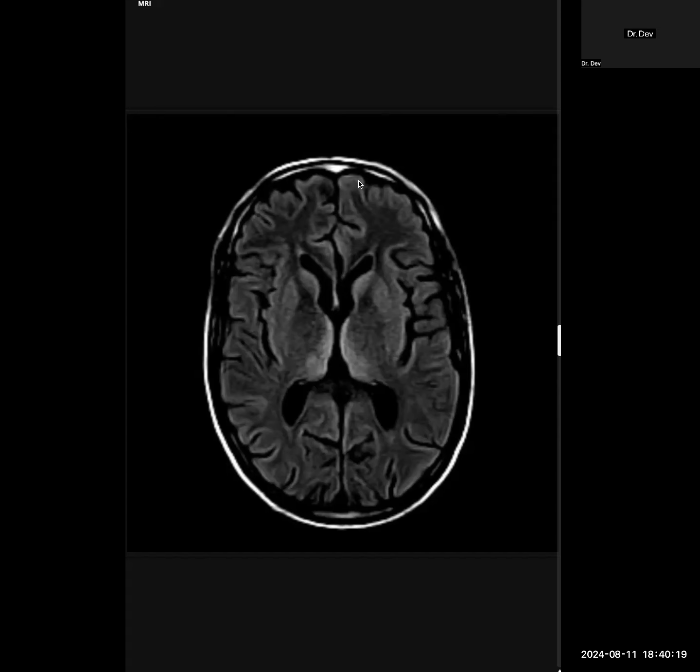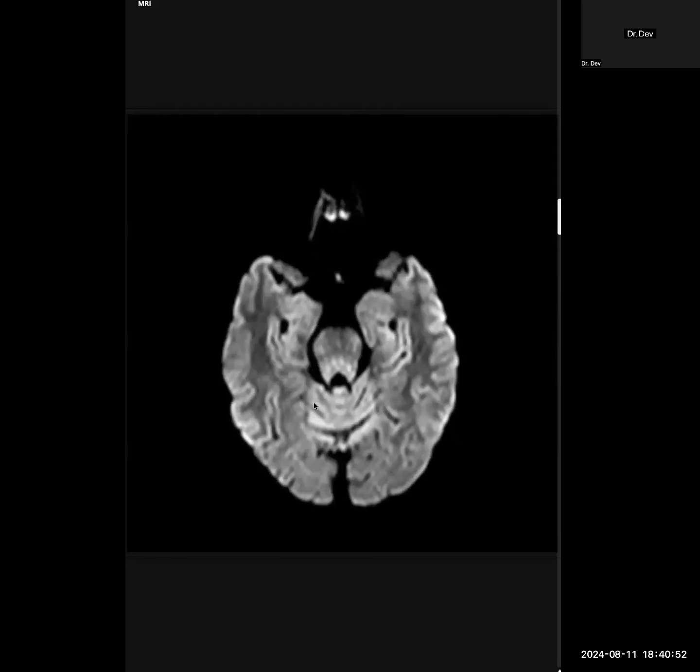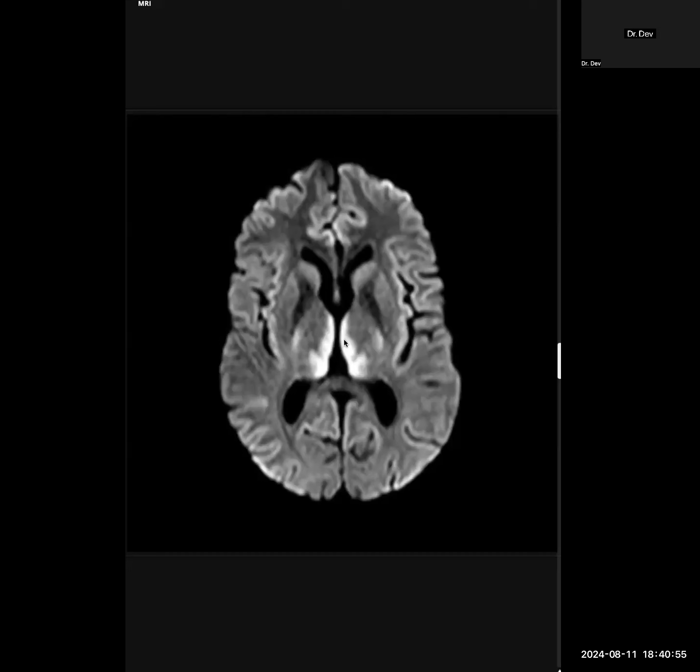But anyway, just use the more general term like thiamine deficiency, because as I said, this case was due to nutritional deficiency secondary to a GI surgery or whatever else. They look the same because it's ultimately thiamine. And when you're not sure about which vitamin, don't even get into that area. Vitamin A, B, you're just creating more problems. In this case I've given you a 6. You've already passed in this case, so make sure you don't make more mistakes about this. It would have been better if you'd asked for the diffusion as well. You could just say in my routine practice, I see all the sequences and I want to see if there's any restriction, which helps your diagnosis.